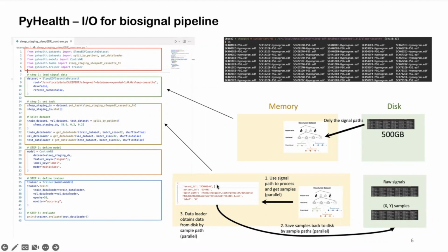Okay, so we can still load it. The other attributes won't be affected. Okay.